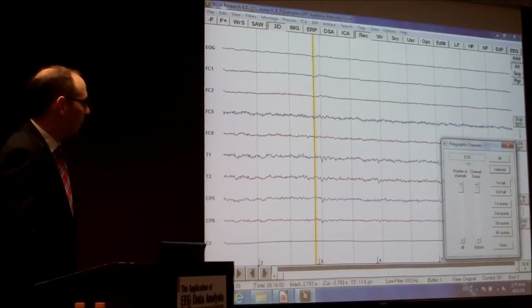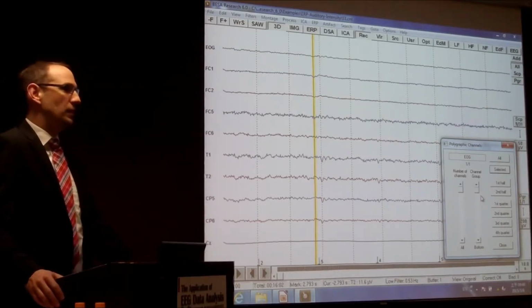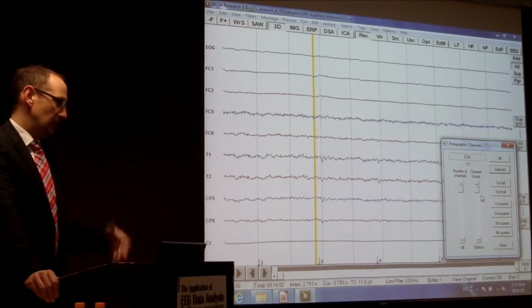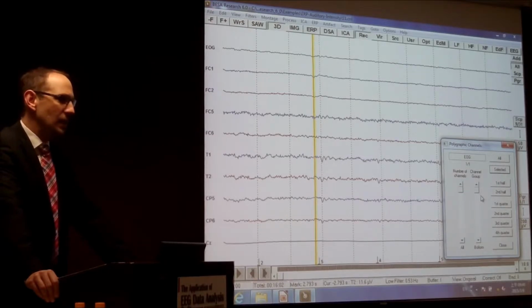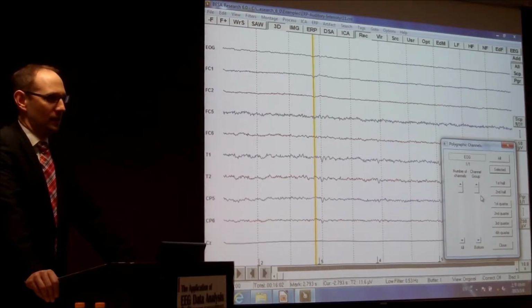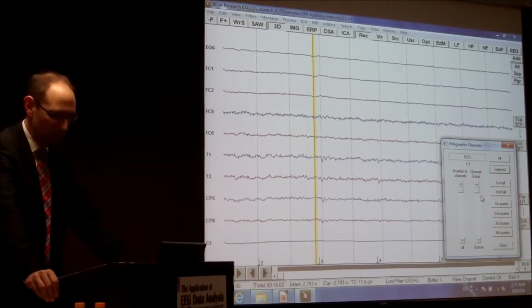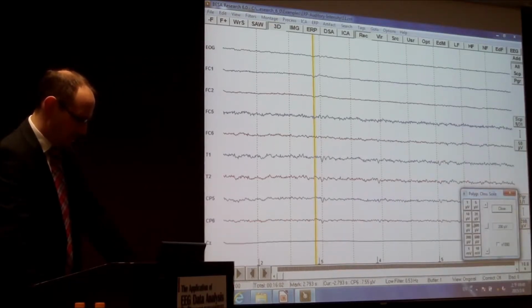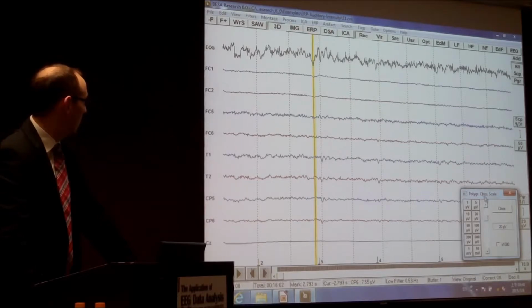The polygraphic channel we have just one, so it makes no sense to group them in some points. But if it comes to MEG recording, you sometimes have a lot more, because if I look at the Neuromax systems, the Neuromax systems have something like 25 of these channels, and they carry very, very big signals. And it makes sense to group them and then to see which of the signals are good and switch them off if you don't like them and so on. So that makes sense. In this case, not. But you certainly can scale this channel separately from the other channels. Okay, now we can see the channel over up here, so it's scaled in a different scale.